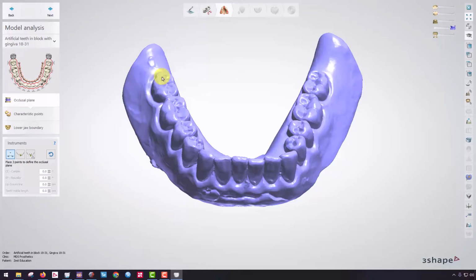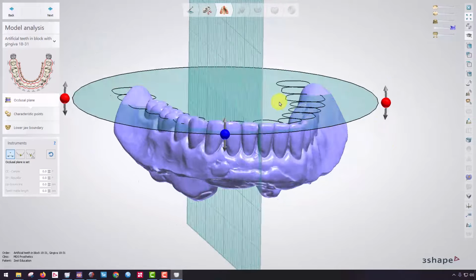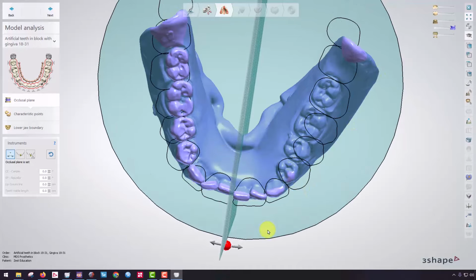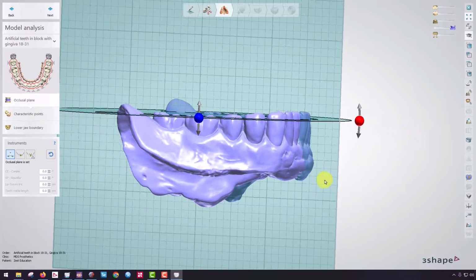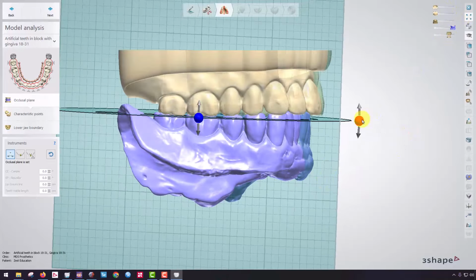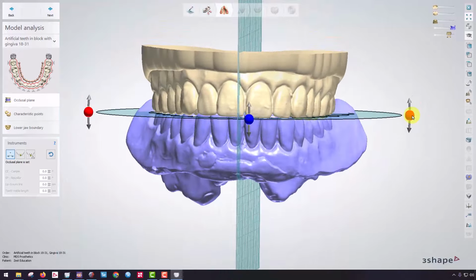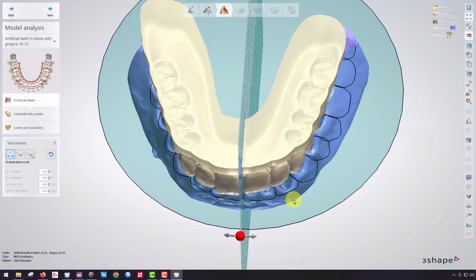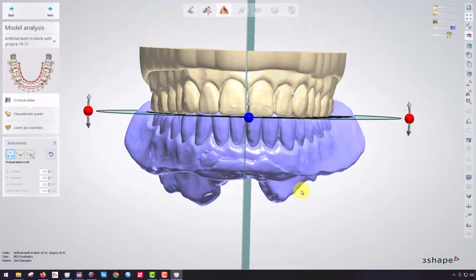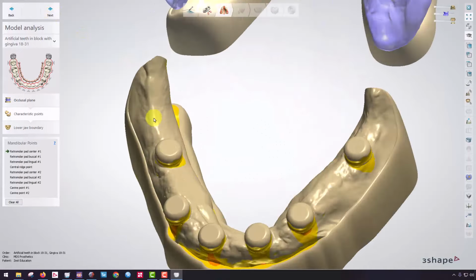Defining the occlusal plane is pretty simple. I'm going to left click 3 points in the approximate occlusal plane and then make some minor changes just to match my occlusion. And this one does need to be a little bit closer to what your desired occlusal plane is, so it's still a pretty good idea to go ahead and bring the opposing arch into play. And you can kind of align this if you need to make a correction or where the patient's midline is, etc. This will be the tone that it sets for the rest of the software. Hit the next button.